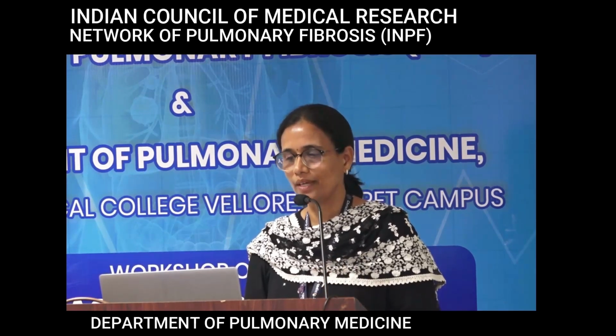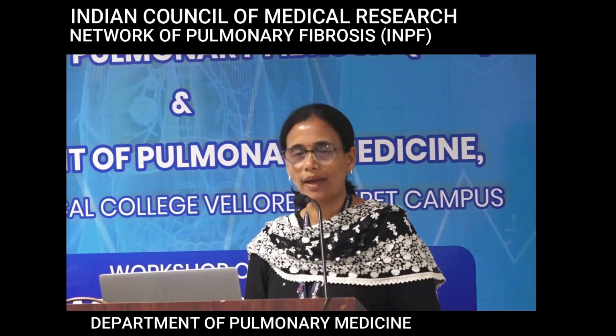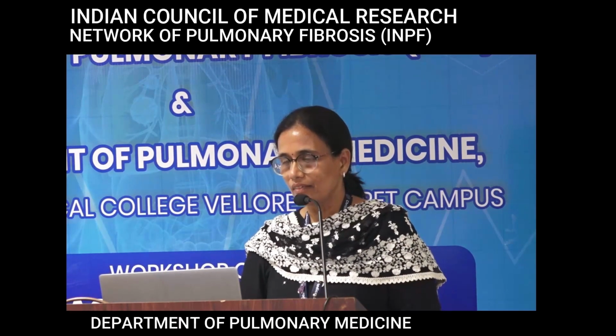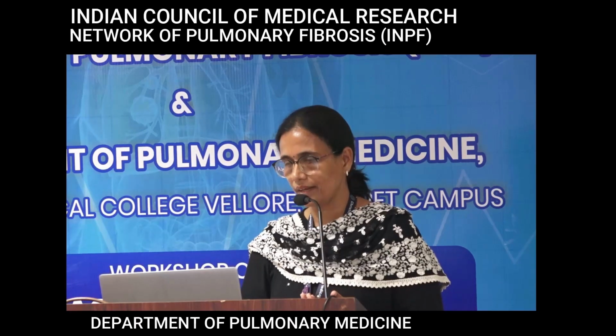With similar subpleural basal predominance, with traction bronchiectasis and reticulations indicating fibrosis but without honeycombing, we cannot confidently state UIP pattern; we will say it is probable UIP pattern. When it is not clear cut, just some reticulations and minimal traction, we'll say it's indeterminate.